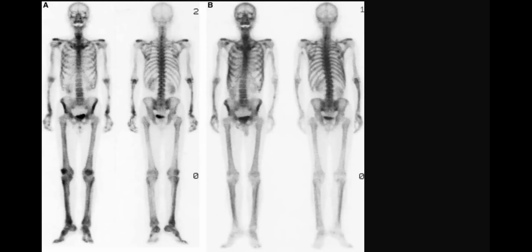Yes, it's a hypertrophic. We have two steps in describing bone scan. First, after presenting, this is a whole body bone scan in anterior and posterior projection. The first item to describe is the presence of renal uptake, yes or no? It's present here, yes. So there is good renal uptake by both kidneys, excluding super scan. It is not super scan, not metastatic super scan, not metabolic super scan.